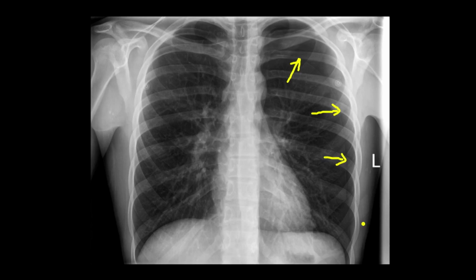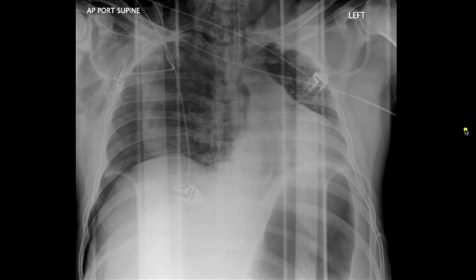And Dr. Stevens, this one is a fairly large pneumothorax, but there are cases where it's a very thin sliver of air, correct? And so without looking carefully for it, you might miss it. Correct. And one of the important things, whenever you see a pneumothorax, even if it's supposedly small, you want to make sure that you're still seeing a third of the heart on the right of the spine and 2/3 of the heart on the left, because sometimes you can get shift of the mediastinum, which is an extremely important finding.